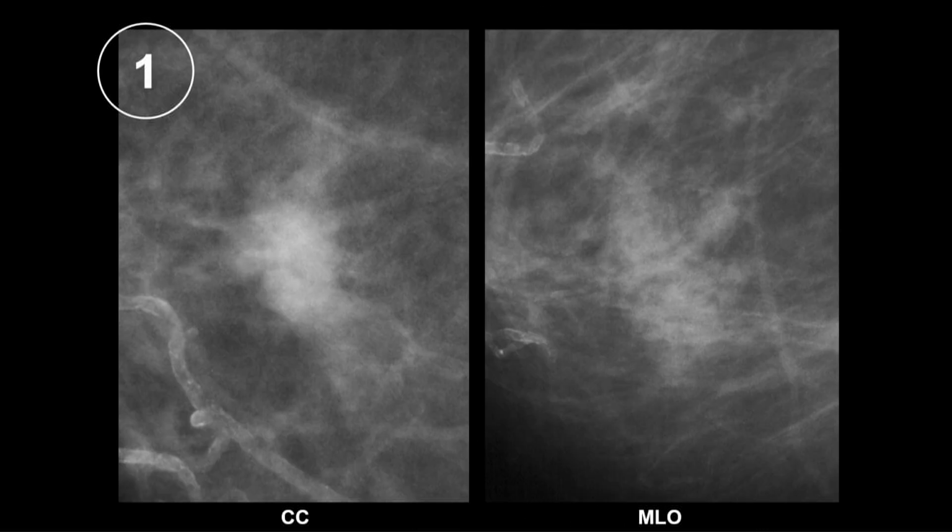Okay? And you can't really tell when you're looking at it, it's so small. So when you're looking at your screening mammogram and you have the current exam and the prior exam there and all the images are small, you need to look at them at full resolution. So we have this, and we have it here where it's spread out into that. Now, most of you are going to look at this and say, you know, it's probably nothing, but this looks so bad that I'm going to recall it anyway, right? Most people would think that way. I don't think that way.